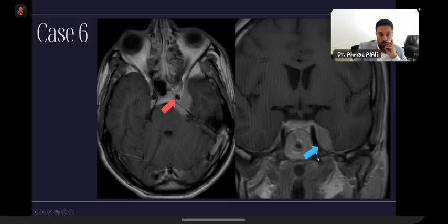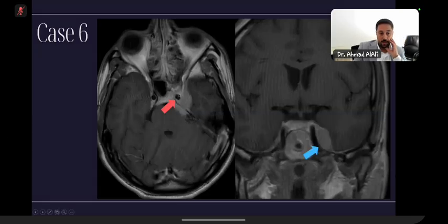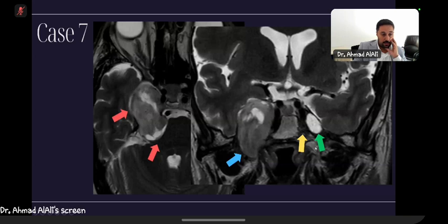Moreover, on the right side image, you can see that the blue arrow is pointing to the broad dural base in here. The lesion is dural based, which is broad. This is a feature of a meningeal-based lesion. And you can see here some enhancement along the dura, which is the dural tail. So this is a dural-based lesion invading the cavernous sinus, encasing the internal carotid artery with a dural tail, an extraaxial lesion. So as described by candidate number 2, this is a meningioma.